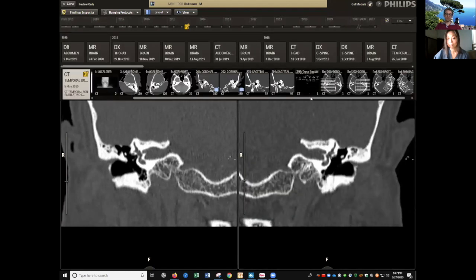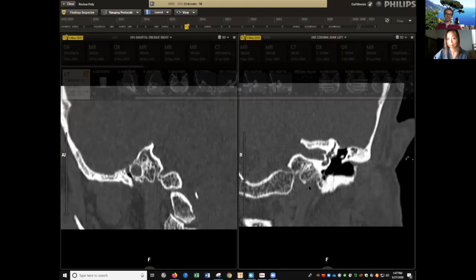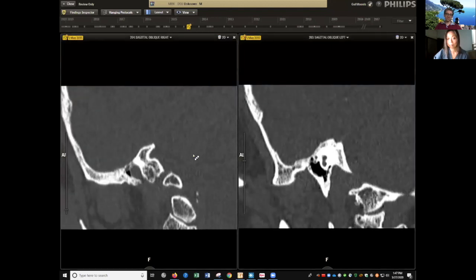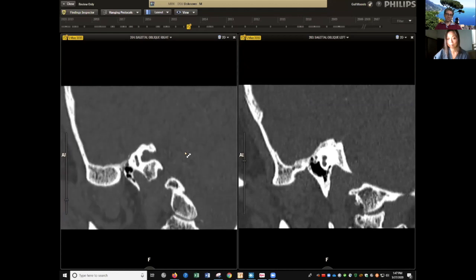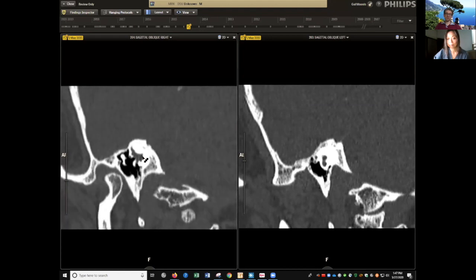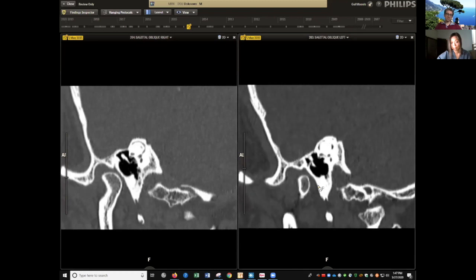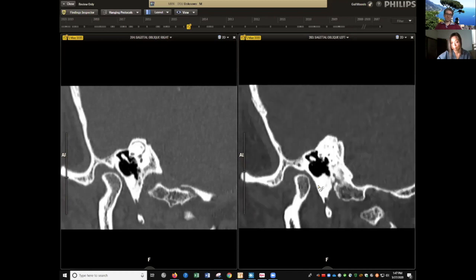So this is where I actually like seeing my sagittal obliques, because I think these sequences really help bring out the ossicles. Even though technically we do them for superior semicircular canal dehiscence, I love these because you can see nicely on the normal side, this is the body, long process of the incus, lenticular process, whereas on the abnormal side, it basically stops short.